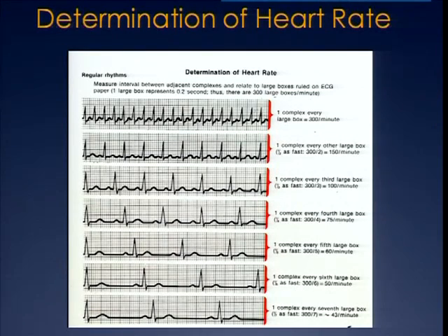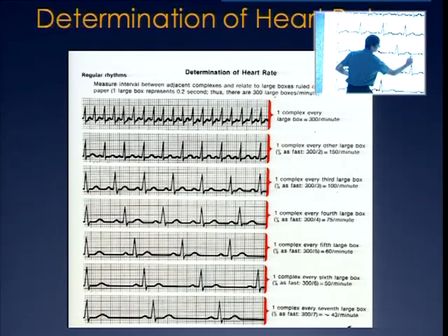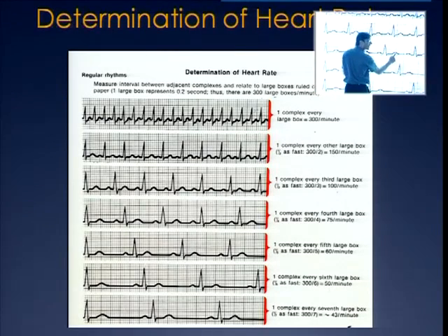Always look at all the QRS complexes, the morphology. Forget this is an ECG. Suppose you think this is a picture, a cartoon of hills, and I've drawn hills like that. Does this hill look exactly like this hill? It's an important thing, because sometimes you may have two humps on this. That may be a P wave hidden in here.